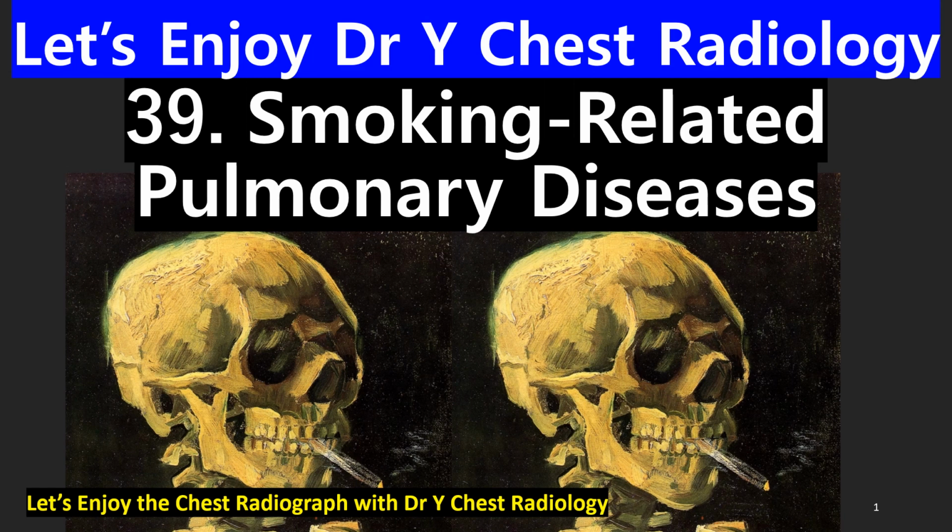Today's session 39 is smoking-related pulmonary disease. Let's enjoy the images of smoking-related pulmonary disease. Let's go.